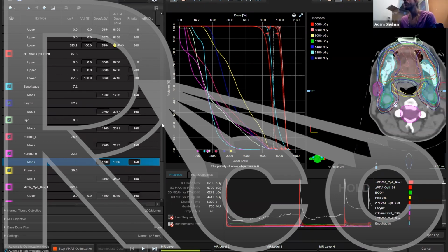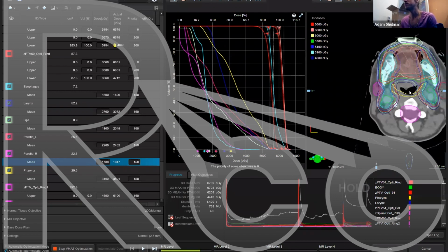Yep. So good question. That was covered in a previous session, so I would refer you to that. There are so many different variations of what collimator angles I would use when. In this case, I only used plus or minus 10 degrees, just so that I could fit my PTV into the field. If you go too far of a collimator angle, sometimes you'll miss field on one side for extended sup inf lesions or tumors.